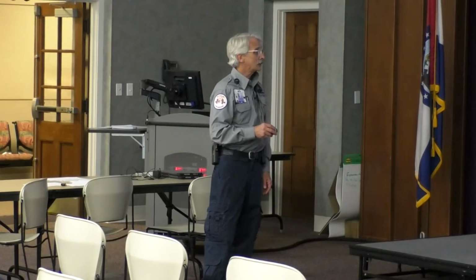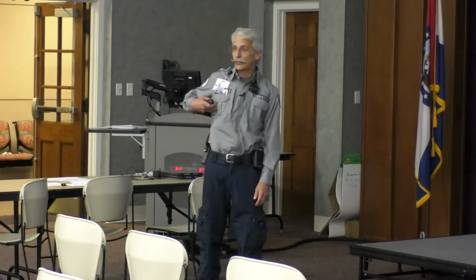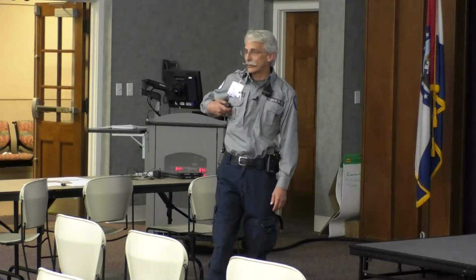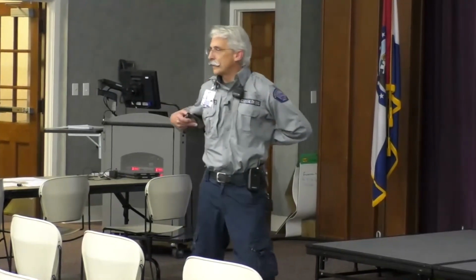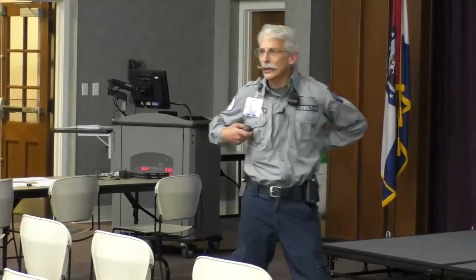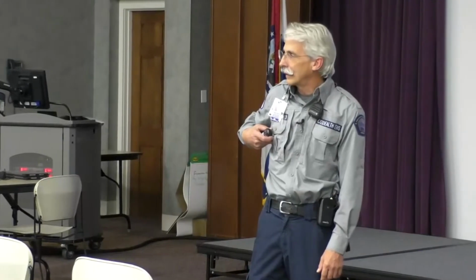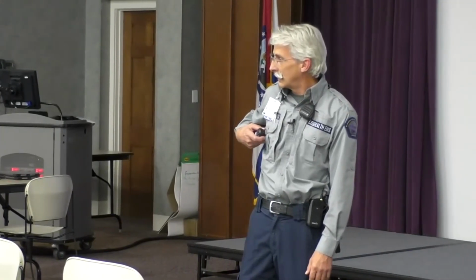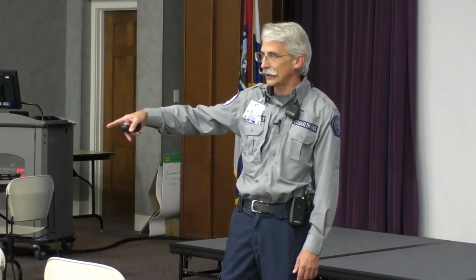I will tell you that I would recommend on this patient that I do a V4R, at least a V4R. Again, I don't really care if you do 8 and 9. Why do I care? If I don't care about V8 and 9, why do I now care about V4R? To know if it's the right ventricle.